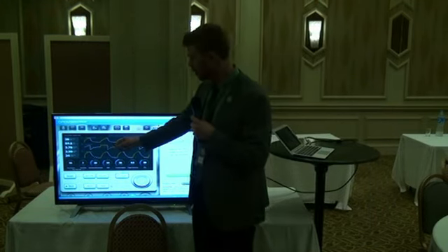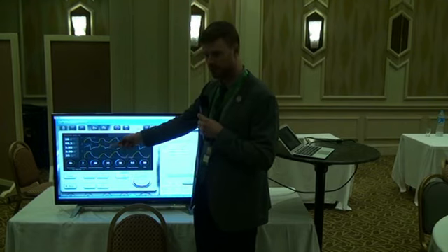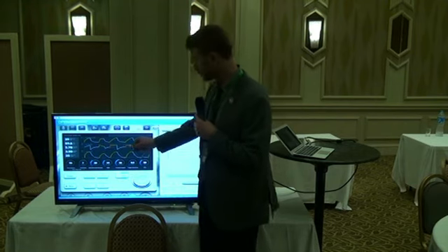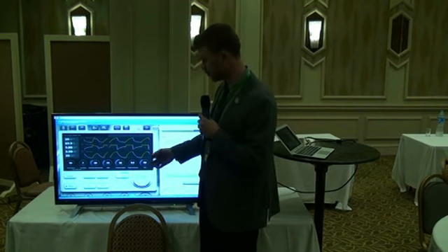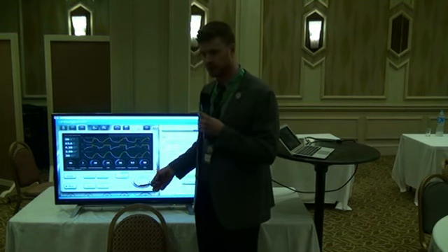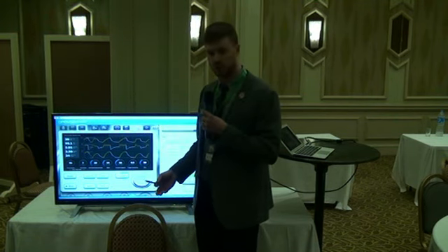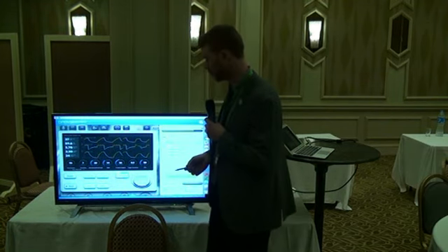So number one, you know the square waveform. Oh, what was that? Pressure support. Yeah. The square waveform is usually indicative of a flow-controlled mode. So this is volume control. You can have a decelerating waveform. You guys have seen that, where during volume control you can choose what the waveform looks like, and sometimes it can look almost like a trapezoid. It's a little bit closer to what pressure control flow looks like.